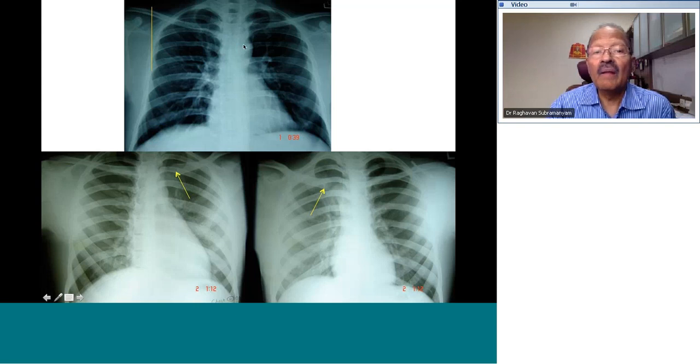Just below the aorta would come the main pulmonary artery, the denser shadow inside, and the lighter shadow outside would be the left pulmonary artery. The left pulmonary artery is actually behind the main pulmonary artery, and therefore often less dense than the main pulmonary artery. Below the main pulmonary artery bulge, you often have a small concavity.